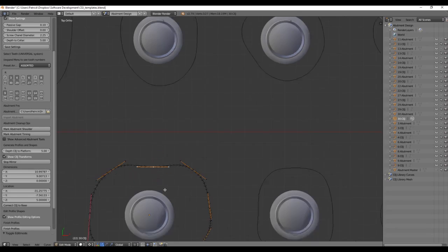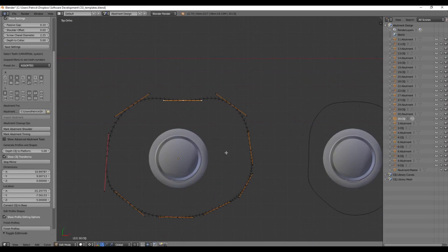are on the side. So you can select a control point by right-clicking, and you can select a handle by right-clicking as well. You can manipulate the handle by changing your pivot point to the median point and making sure that you've got the manipulator widget turned on. Now we can drag this control point around.